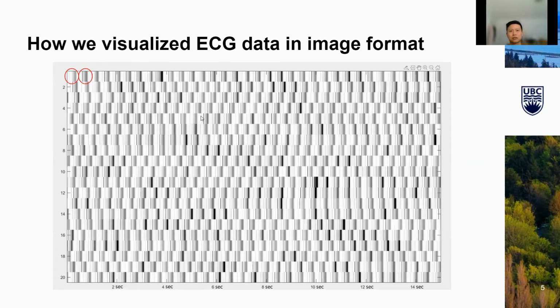I highlight the red circles on the image here. They indicate the peak of the heartbeat. One cycle is the distance between two peaks. Therefore, a large separation between peaks of the ECG means a lower heart rate that takes more time. A short cycle has less white space between the peaks. That means we can use this figure for the diagnosis of heartbeats.